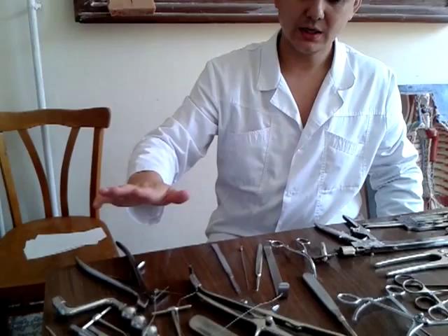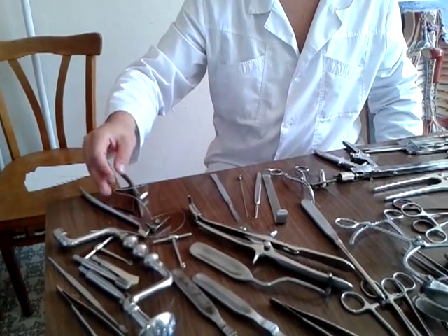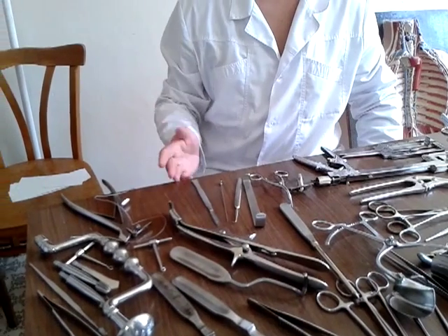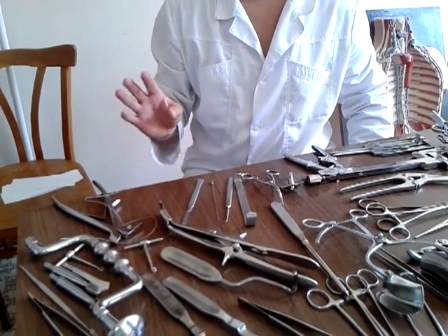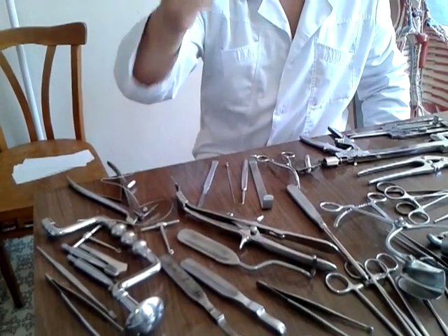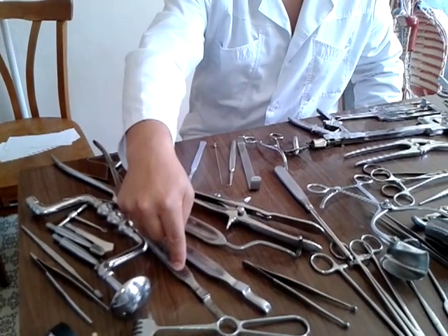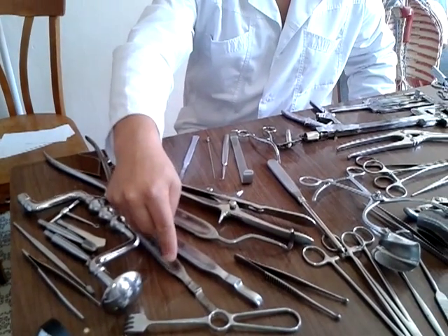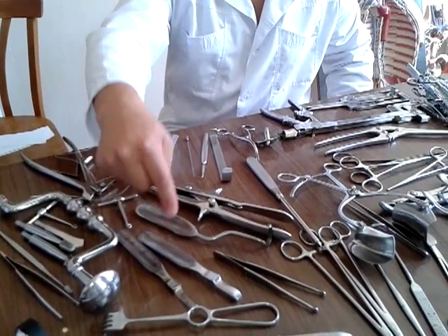Okay, that is trepanation. The next operation is resection of the rib. What does resection mean? The partial removal of the rib. The instruments which you need for subperiosteal separation are the raspatories: first the straight Farabeuf's raspatory, second the curved Farabeuf's raspatory.